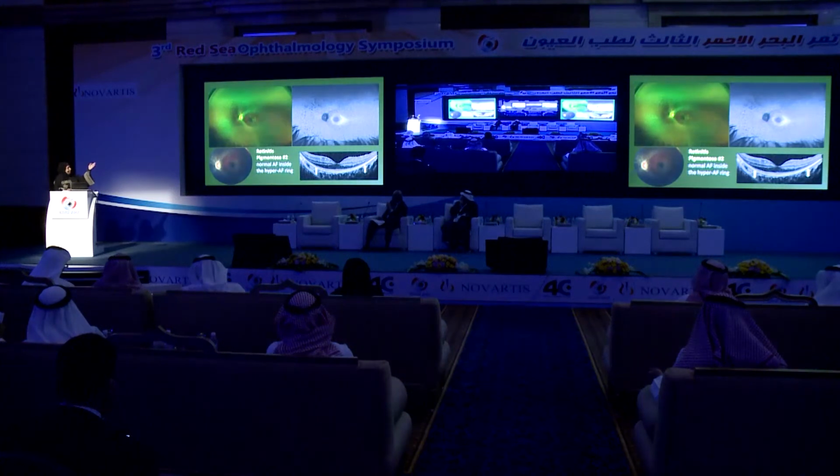The ring here is a little bit bigger and larger, and the central area is slightly larger. You can see that there's also preservation of the outer retina, and therefore the patient does have a tunnel field, but you can estimate how much field is remaining by looking at the ring. And if you follow the patient non-invasively with autofluorescence, you'll notice how fast the patient is progressing, because this ring will tend to constrict over time.